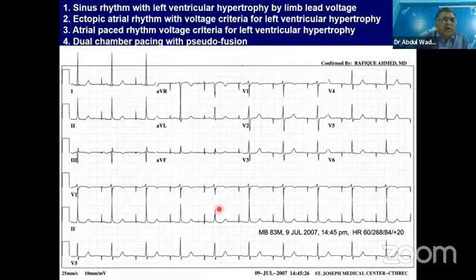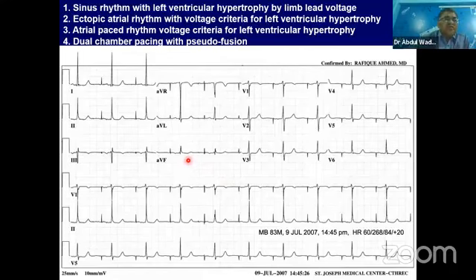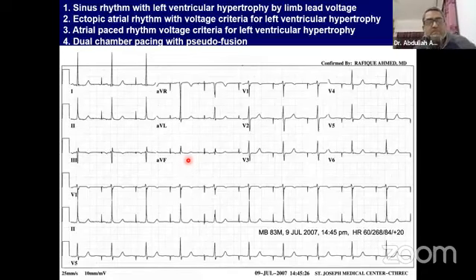But in case of AVL, it's also 10 millimeter only. It doesn't fulfill as well. How about lead 1? But lead 1 is tall. That's the problem. Sir, may I ask one question? Sure. So is it that the ventricular pacing spike is falling on the R wave?